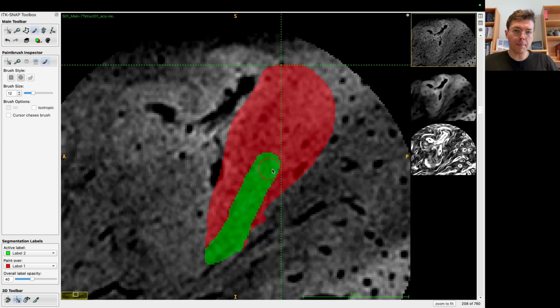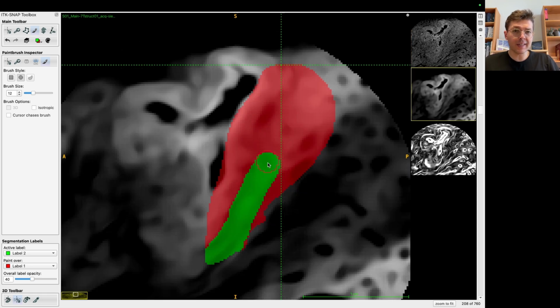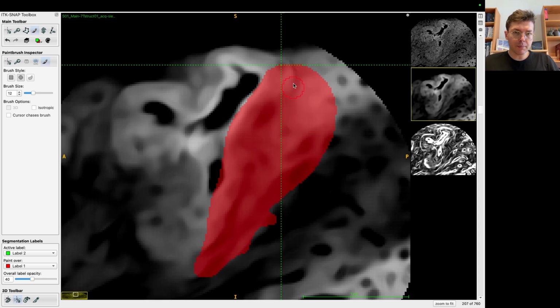So now this is, for instance, what I'm talking about. There are some places in Heschl's gyrus where it's really hard to decide where is the white matter, gray matter boundary. And in those places I try to find where I see the boundary. Like here, I really see it. Like see there. And here, I really see it. Like it's there, the boundary.